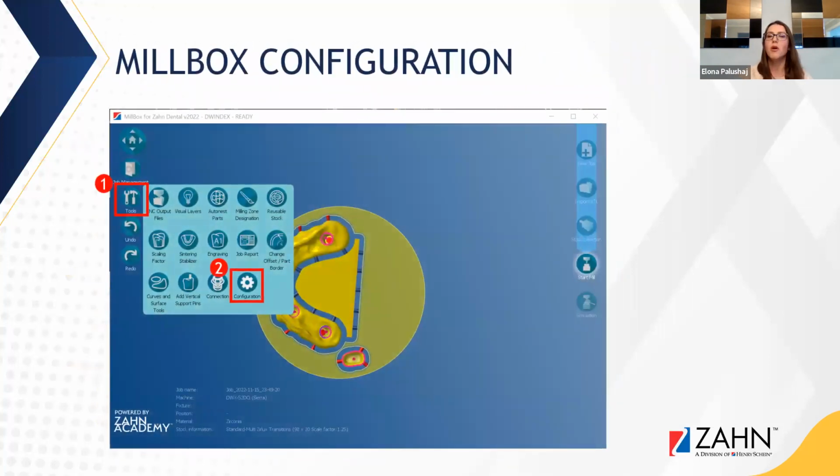All right, so MillBox configuration. For those of you who don't know, in the more recent versions of MillBox, you can access the configuration menu under Tools. There's no passwords required. There's a lot that can be done there. Definitely be careful with what changes you make. The most important advice that I can give is write down whatever changes you're making, so that if something goes wrong, you know how to revert back, or call your support team so they can help you revert back and fix if anything is broken.